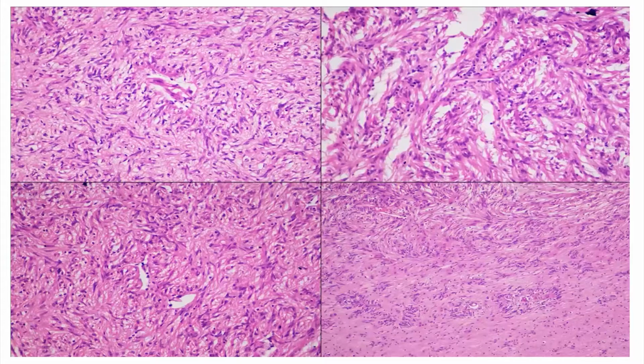So any guess on the diagnosis, just on the basis of morphology? A low-grade pediatric tumor showing perivascular arrangement of tumor cells in a whirl-like fashion, radial arrangement of tumor cells around the blood vessels.